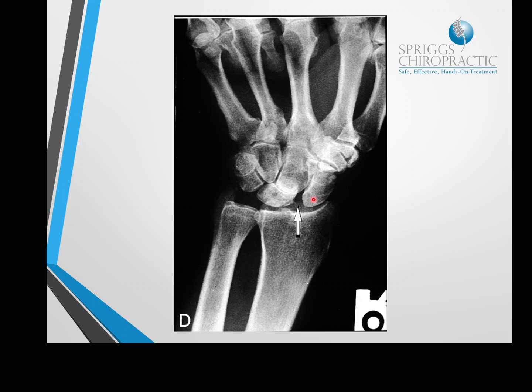On this particular image, you can't really see much in the way of calcium being deposited. I could argue that there's a little bit here next to where the arrow is sitting, but otherwise, the image contrast is high on this one, so soft tissues are very much going to be invisible. So it's not a good quality image.